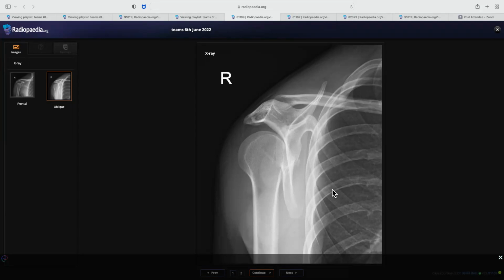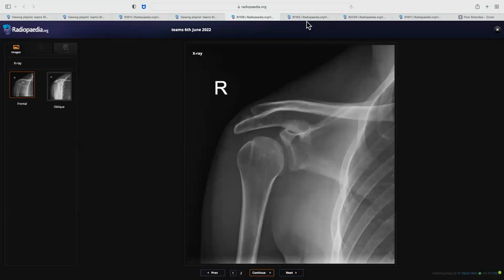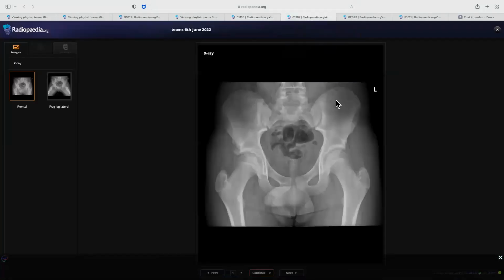These are seen in the frontal view. Otherwise, in other views, we will see that the humerus is displaced posteriorly from the glenoid, away from the chest. So if I go back to the frontal view, can you appreciate any sign of posterior shoulder dislocation on this radiograph? Yes, I can see the light bulb sign, and I can also see the trough sign.